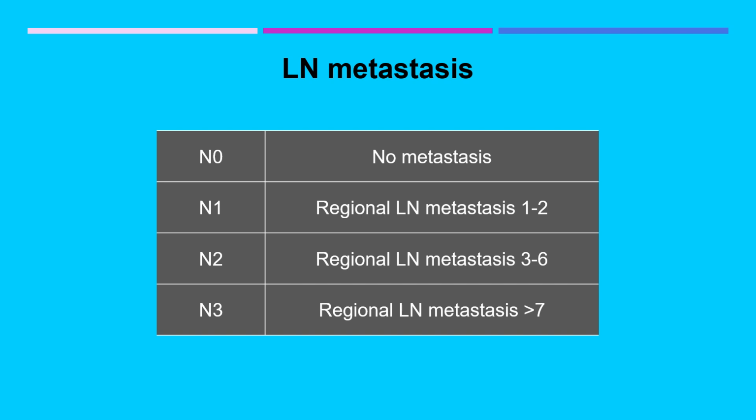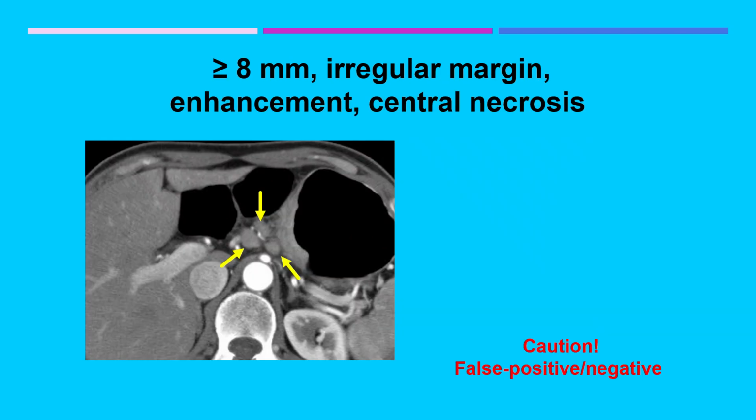The nodal stage is determined by the number of metastatic lymph nodes. CT evaluation of lymph nodes relies on both size and morphology.